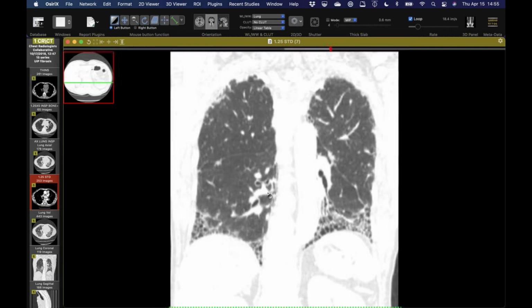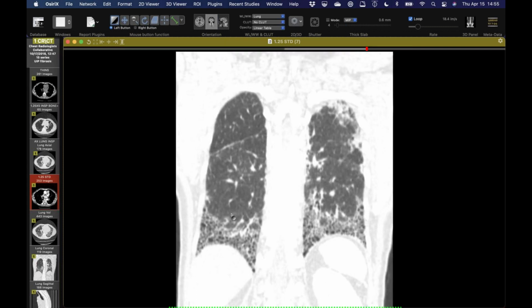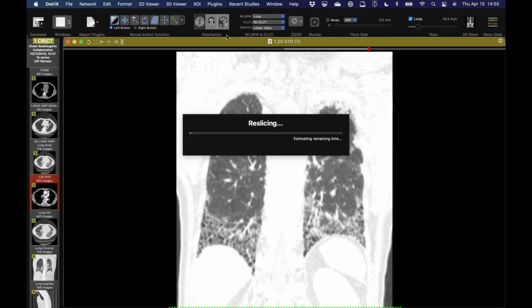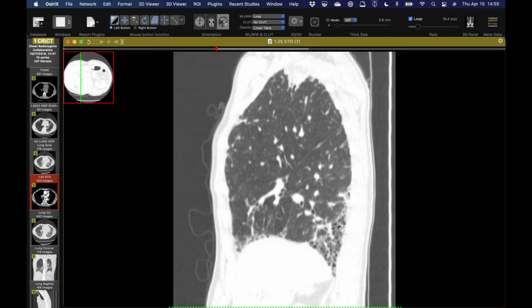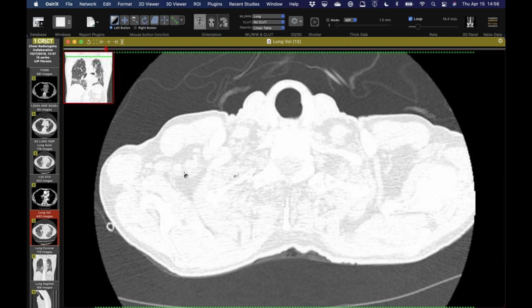And you can see there's clearly a fibrosing lung disease, but we'll look at the distribution. So in the upper zones, it's kind of patchy, it's very subpleural, and it's kind of dense. And then there's quite a bit of anterior, even confluent cystic spaces, so honeycombing or honeycomb-like cysts. Clustering, I think this would meet criteria, but has this really thick fibrosis peripherally. And as we go down, it's clearly basal predominant. It stays subpleural. And then all the way at the very bottom, we start seeing what I like to call exuberant honeycombing. They're not the biggest cysts, but there's a lot of them.